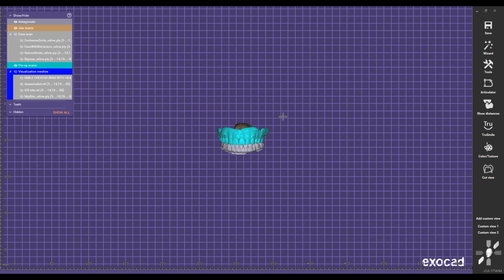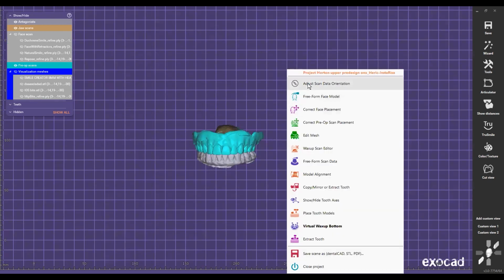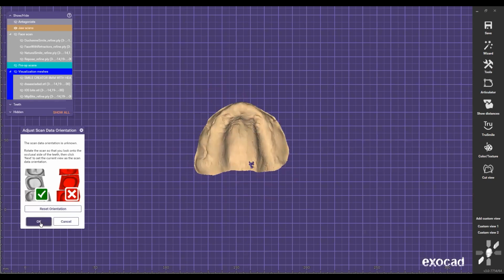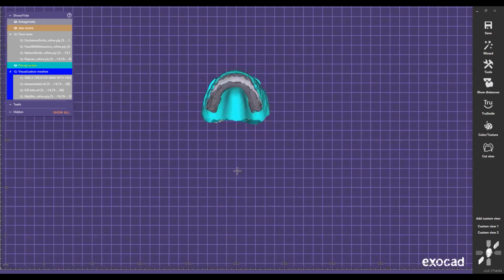So that way everybody can jump right away to start doing these cases step by step, and the software is gonna guide them how to do it. So first thing I need to do is just put this information to my occlusal view. This is not insertion direction. I'm just telling the software that this is my positive surface, my working surface, so I can orient everything accordingly. So once I do this, I'm gonna go to the next step.